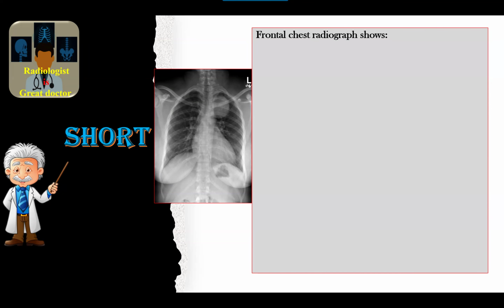So diagnosis: posterior mediastinal mass. This could be different. I can write differentials like neurogenic tumor or esophageal duplication cyst. It could be hematoma. No need to mention many diagnoses, by the way, in the short reporting. And management again: MR of the same region, good, for confirmation.